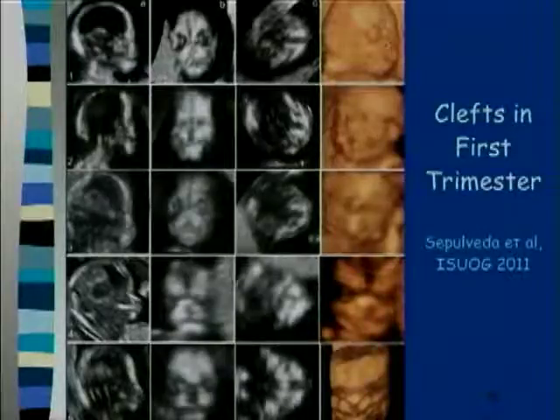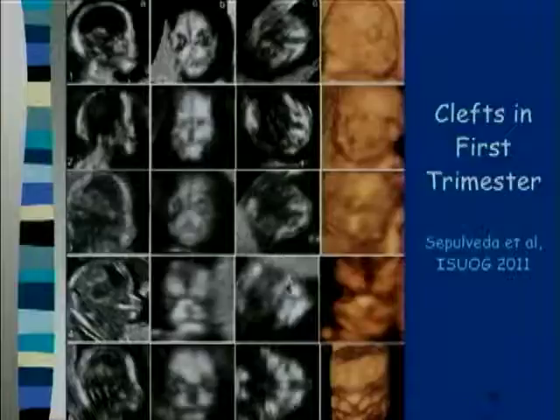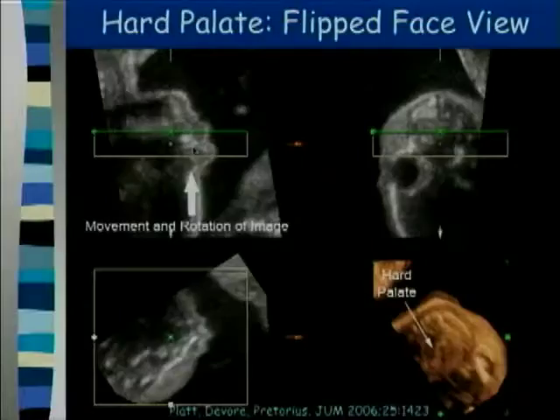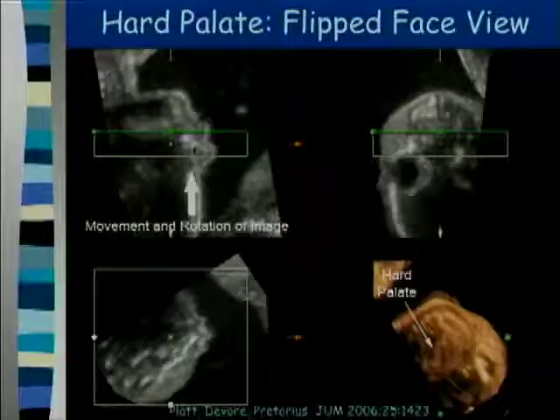Now, he does have the rendered views, which I think do show the cleft, but they're pretty hard to see. But I'm quite impressed with his pictures of the hard palate cleft there, this one's a bilateral, and here's another unilateral. And you can see these on this frontal view in a picture similar to the retronasal triangle.